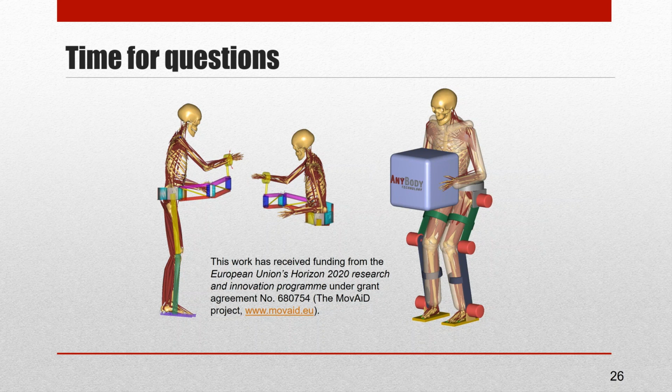You just change a number and you look on the screen what that means. I mean, what kind of posture do you get now, and then you change it a little more, and then you have maybe the keyframe that you're looking for. Then you take note of what those postures are in terms of the joint angles for the different keyframes. And then you create interpolation drivers that will interpolate the same joint angles between the same postures, and that's actually all that you have to do to model the keyframe motion.